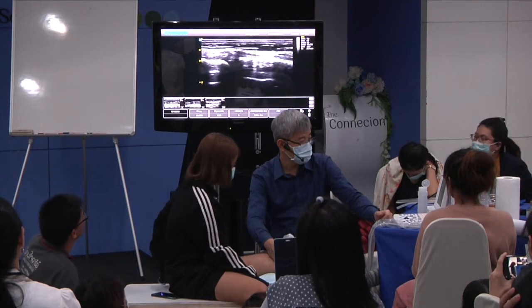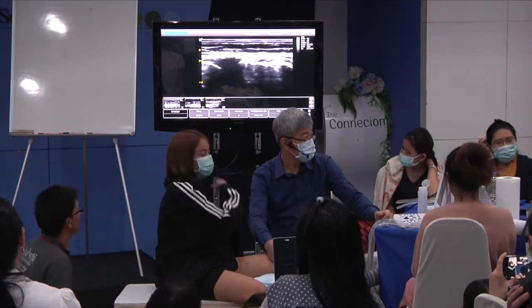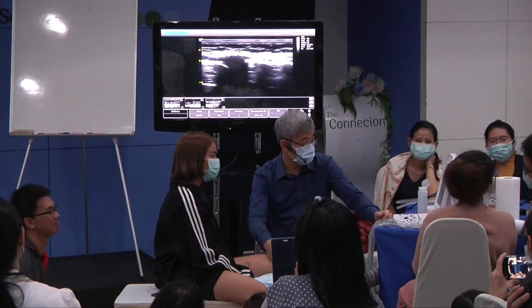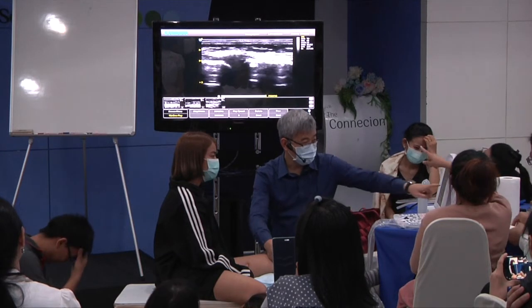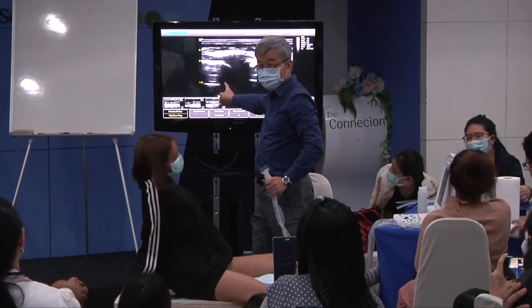Medial collateral ligament. Become dark, right? Very easy, piece of cake. Very, very easy. And the heart shape, the triangle shape, is still here, looking at you, right?